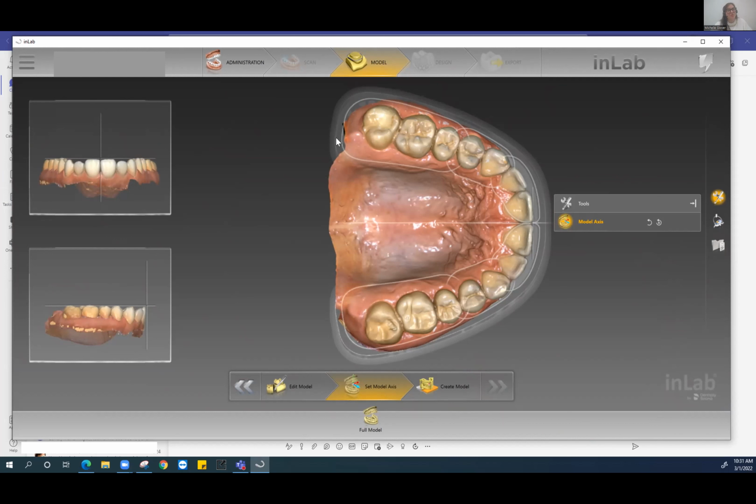Now, one thing to note, this horseshoe size here of the jaw, it's a standard size, right? Sometimes you will have a jaw that is slightly larger, more broad. Sometimes you'll have one that's a little bit more internal, right? If it's a little bit more narrow, it'll be more inside here. There is no right or wrong. Again, what's key here is the midline and the facial lip support.